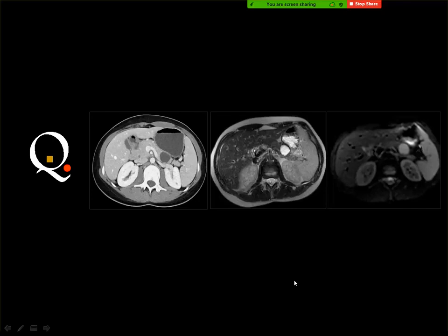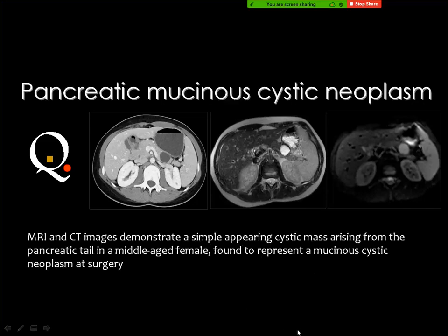Pancreatic cyst. There is no simple pancreatic cyst, and this cyst showed diffusion restriction. Abscess. Mucinous tumor. There is a tumor. You should know that the pancreas does not have a simple cyst.